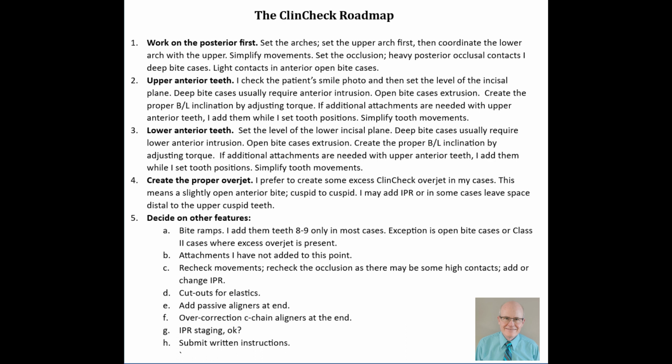Is the IPR staging okay? So I'll usually run live update, and after live update is run, I'll just recheck that staging. And if it isn't okay, then I'll submit some written instructions. So that's how I go through every case. And we're going to take a case here, and for about the next 5 weeks, I'm just going to go through the whole case step by step. Each week, I'll work on one of these steps. So next time, for next week, I'll work on setting the arches of this case.